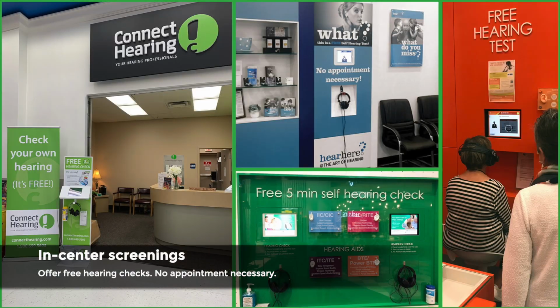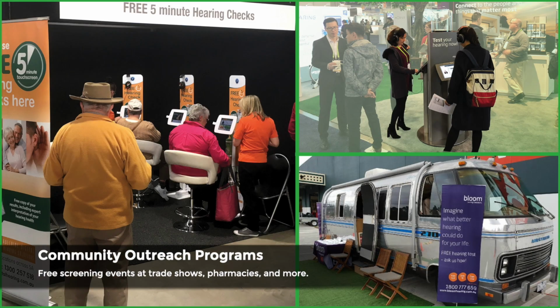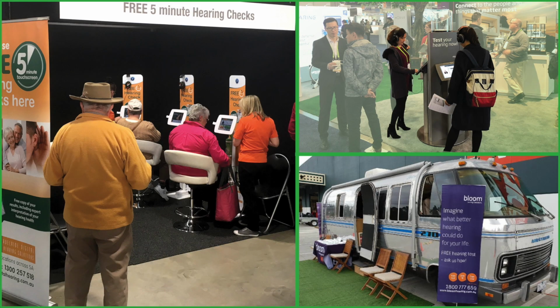G'day. I strongly believe that our touchscreen hearing check continues to be the absolute best solution for hearing care organisations around the world, for pre-screenings in the hearing centre, and also to take hearing services out into the community as part of a community program. But I'm not always sure that the touchscreen hearing check is being configured by clients to utilise it in the most effective way. Okay, so let's look at the administration area of the app.